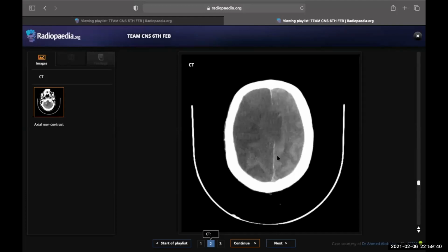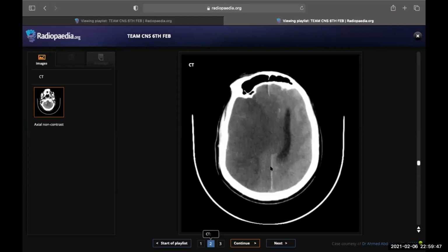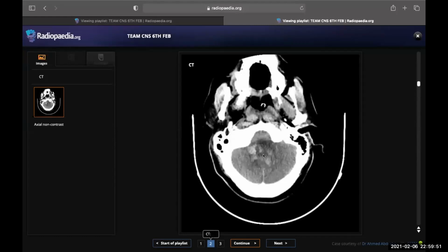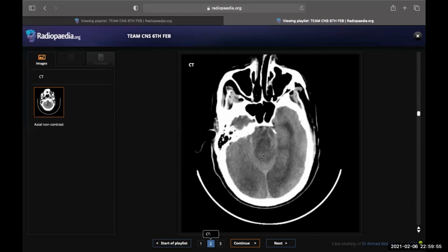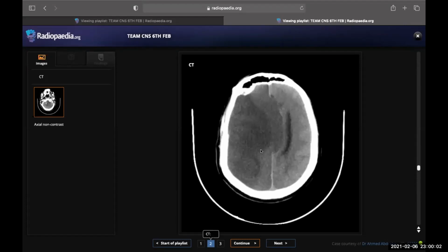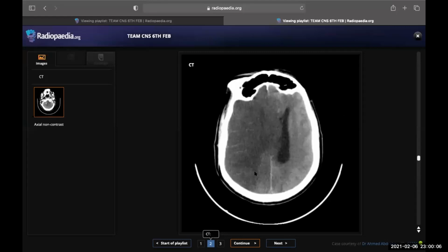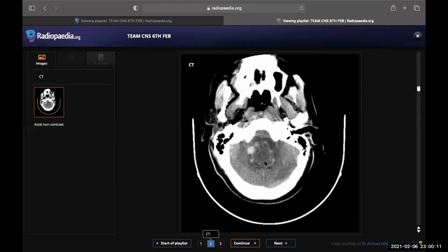The anterior cerebral artery. So this was the hemorrhage due to the pull or the push or whatever you want to call it, due to the effect on the ACA. And this is brainstem hemorrhage when there is uncal herniation. These are the Duret hemorrhages, okay? So this all can be put up in one pathology: a large infarction in the right cerebral hemisphere with subfalcine herniation and uncal herniation. The ACA is injured, so there is hemorrhage on the left side, and there is Duret hemorrhage because of the uncal herniation and the stretching.